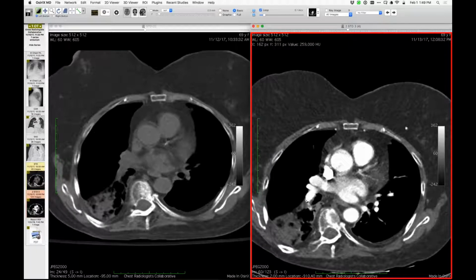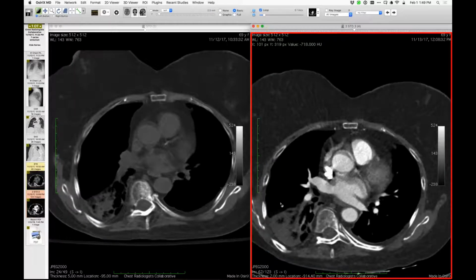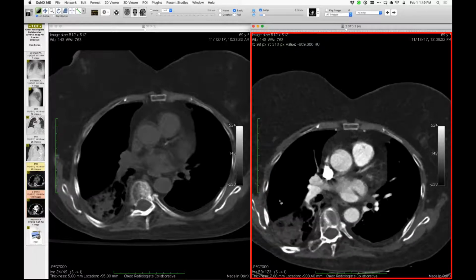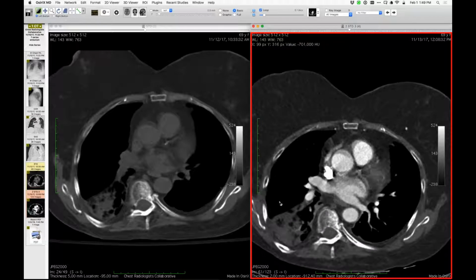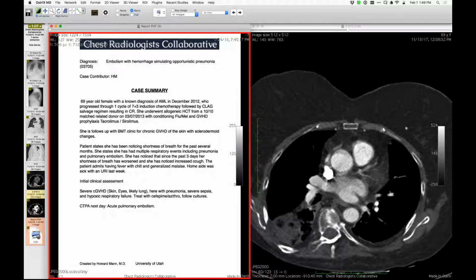So, Travis, I think this is kind of in that area, and then the clot goes off right down there to that area. Was the patient neutropenic? I missed your history. Oh, let me get the history.